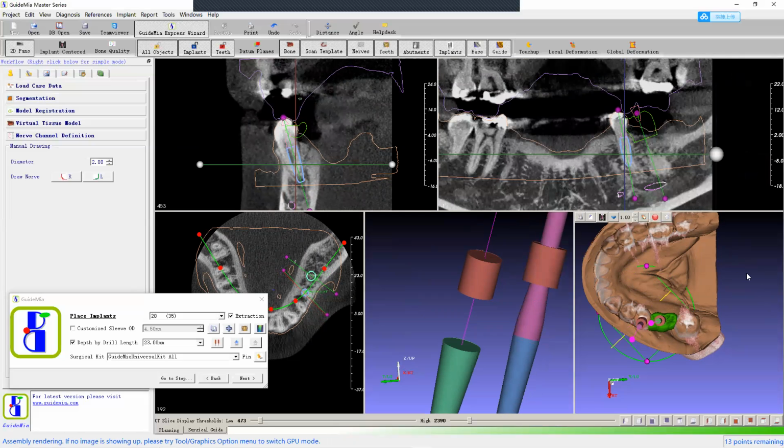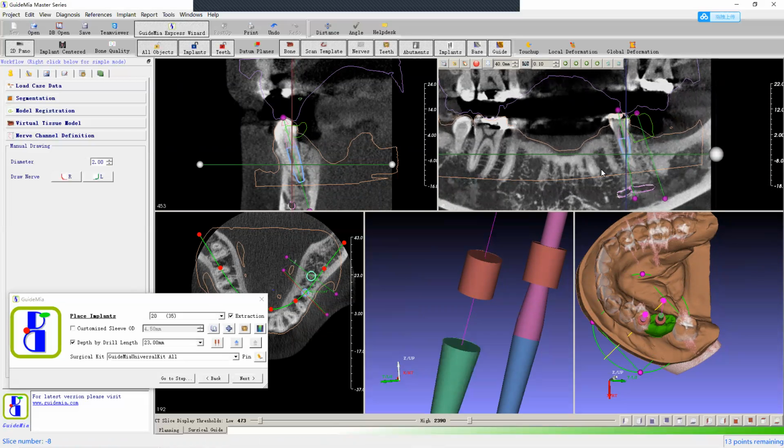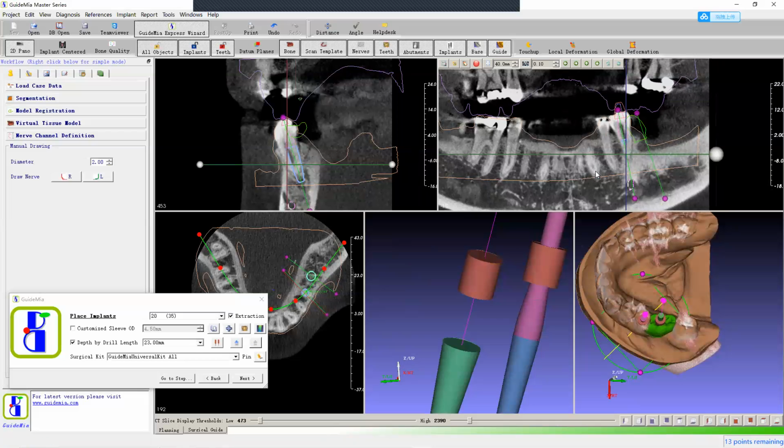Okay, go ahead, what's your question? Yeah, just with the sleeve, how would you know where? If you have, like, 19, we know that we want the sleeve not touching the soft tissue. Now with this immediate extraction, it's got to be small enough to fit in between. If you have two teeth, it's got to be small enough to fit in.